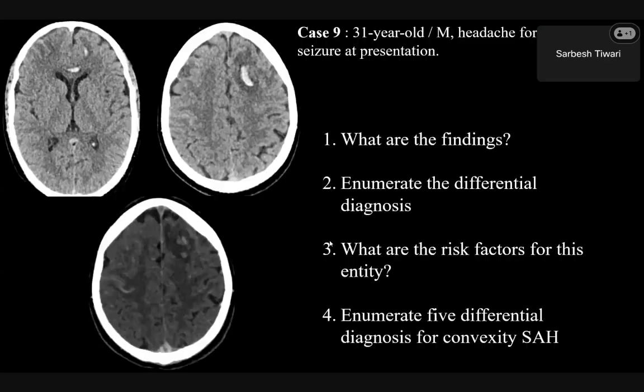Very good. So you have 3 images over here. This, what kind of bleed is it? Does it have a name? Developmental AVM. Hemorrhagic venous infarct, secondary to CVT, aneurysmal bleed, SAH. All right. Now, tell me the cashew sign. This is Ronak Purohit. Excellent. Geeta, excellent. So this is called a juxtacortical hemorrhage. A juxtacortical hemorrhage. And if you like to name everything, this is a cashew nut sign for you.